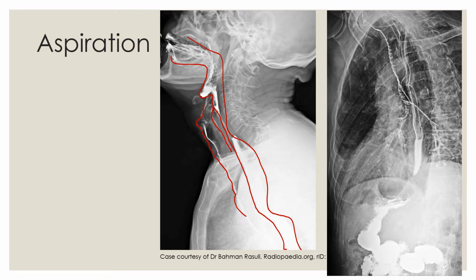And so if this is a lateral view, as I said, and this is another lateral view. Well, actually, this is a bit more oblique, so the patient is in between an AP and lateral view. And so what we can see here is the trachea is very well outlined, as well as the bronchi and bronchioles. We can see the normal esophagus here going into the GOJ and into the stomach. And so this is quite bad, and this patient will require chest physiotherapy to prevent infections which may happen as a result.